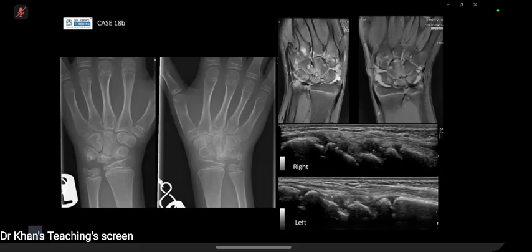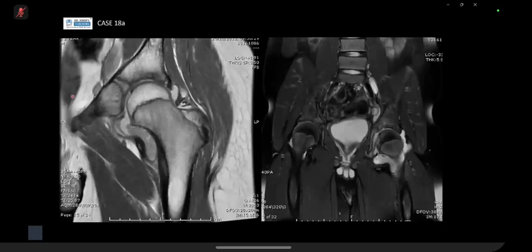Okay, and if you're thinking of an inflammatory arthritis in kids, is it called rheumatoid? Juvenile rheumatoid arthritis, it's occurring more with ankylosis. It's the juvenile rheumatoid arthritis. Yep. Okay, good. So well done. So MRI of the hip, T1 and T2 STIR, and nicely picked up.